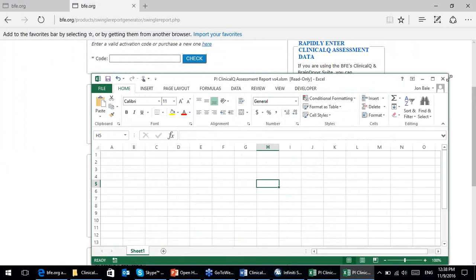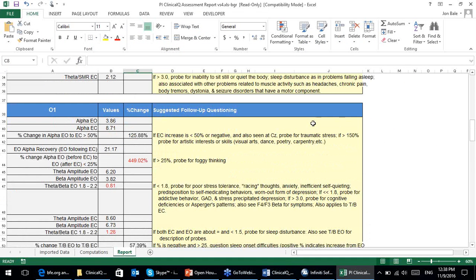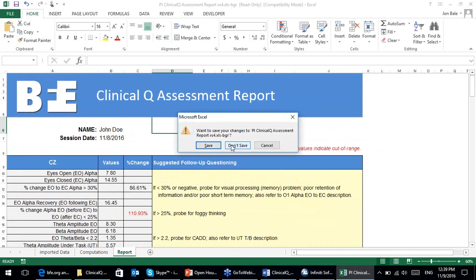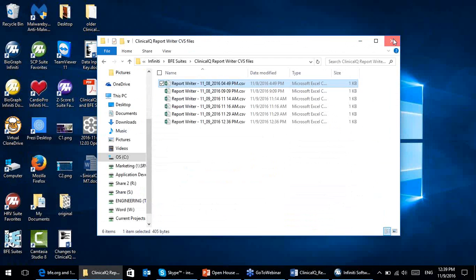Okay, so let's just close this. Just make sure in my notes I don't have anything else. Yes, this report is also kind of an easy to print issue. So we did get comments from people how in the previous version of this report there are different colors, and when they tried to print it in black and white, the colors went off a little bit. Don't worry, we fixed that. It's now just going to go to all white with the exception of these numbers that will be identified. And so it's going to be printer friendly for those who want to save on that printer ink, because no one wants to spend money on printer ink. Oof, much, much too expensive.